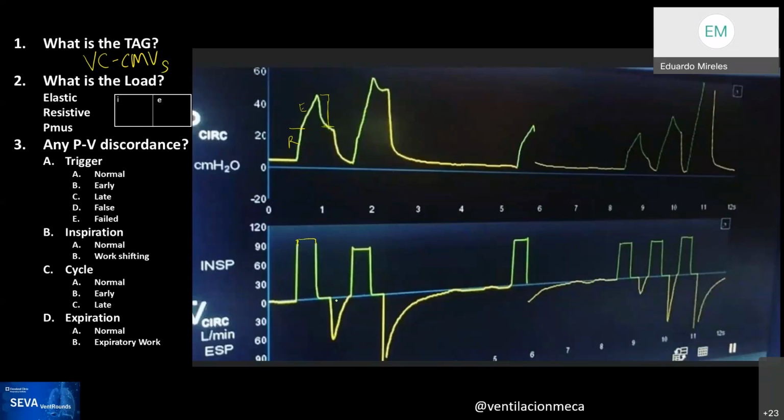There's a breath with almost no exhalation or with less exhalation than expected, and another breath in, and so that breath that had been delivered, now the patient is receiving another one on top of that. And because it's receiving another one, now you're seeing a drop in compliance because you're over distending the lung. And the same thing happens over here.